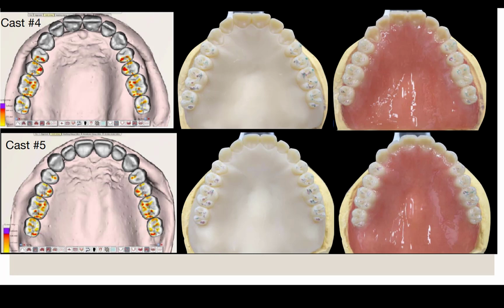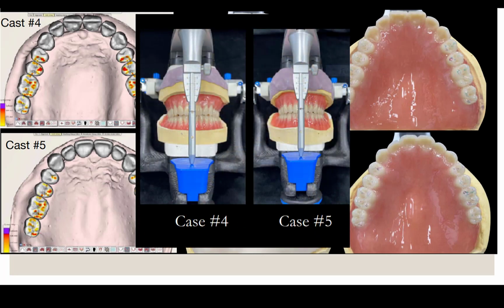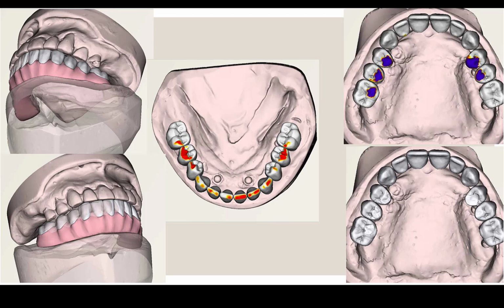What you see here is an occlusal contacts mode, basically pressure mapping within the program. Digital occlusal analysis allows easy visualization of heavy destructive contacts or guidance. Here displayed is an example of how occlusal points are coincident, and the articulator can be used as the final verification.